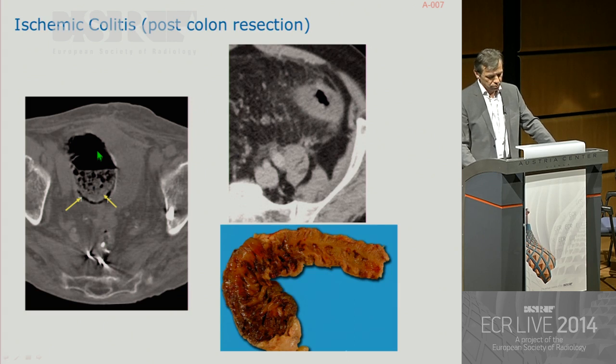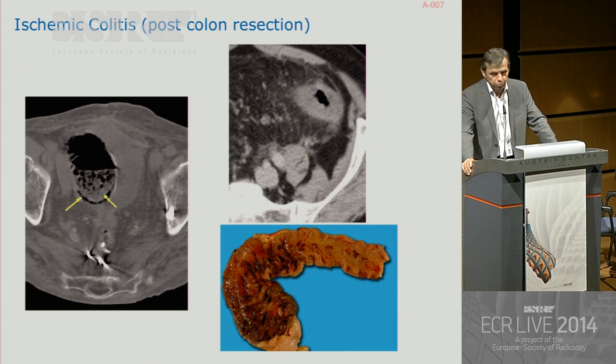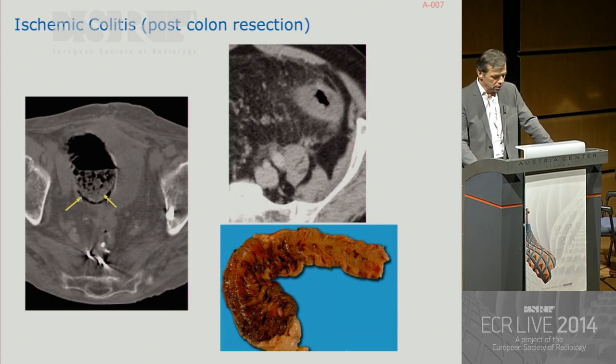Another case, which is very different, is 2 days post-surgery and colon anastomosis. You can see this abnormality of the left descending colon. At the area of the surgical clip, you can see pneumatosis, and that's post-surgical ischemic change, which is common, and the patient needs to be reoperated to remove this area that is completely ischemic.